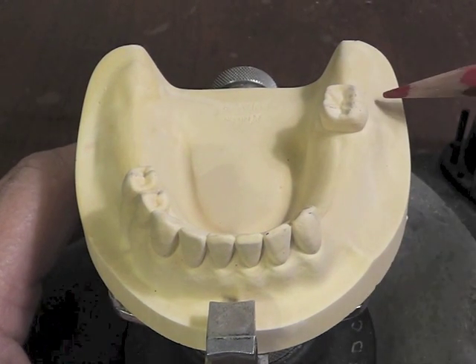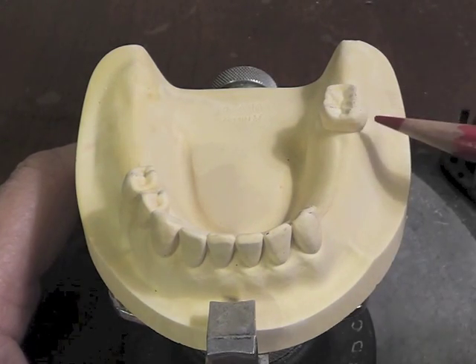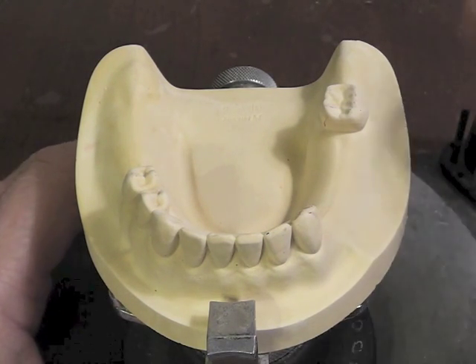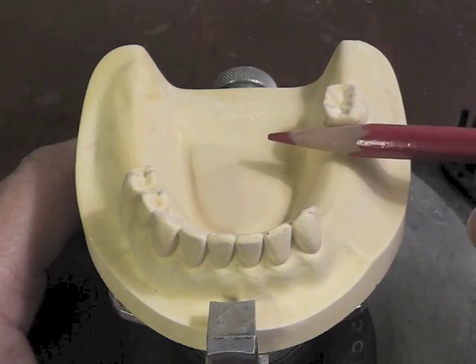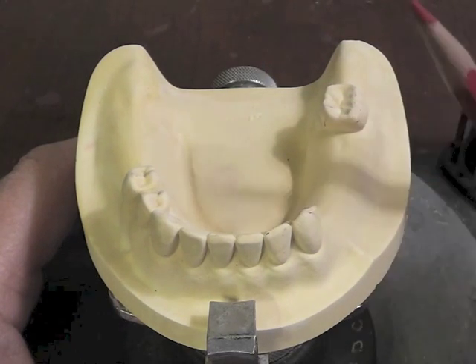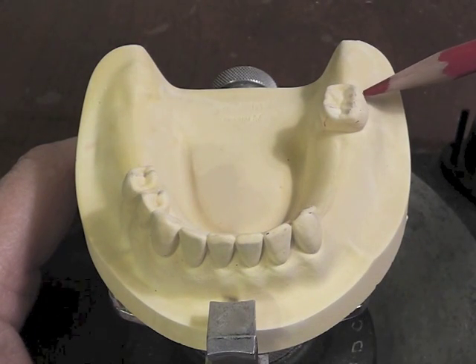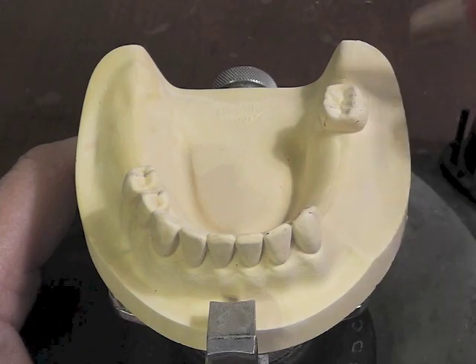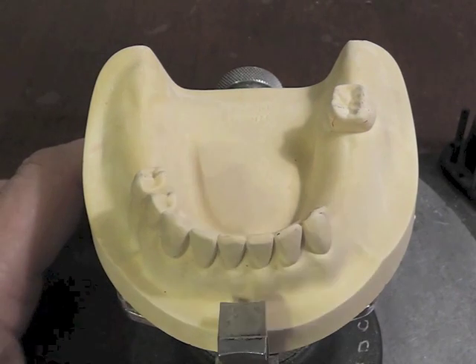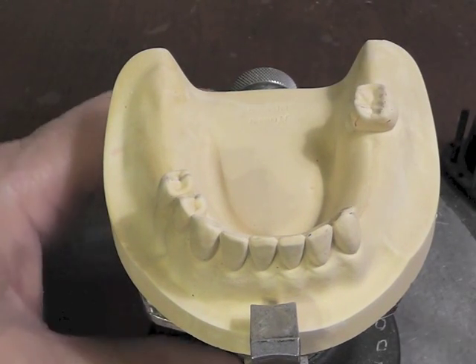So we're going to look for undercuts on the buccal and on the distal lingual, but at the same time we're going to look for them on the mesial buccal and the mesial lingual, because this tooth back here, when it doesn't have an opponent right here, will often lean to the mesial and lean to the lingual, and oftentimes there isn't a good undercut on our distal buccal, and there are good undercuts on the lingual aspect. So we're going to look at all those undercuts, but we're going to think in terms of some type of a rigid clasping on that tooth.